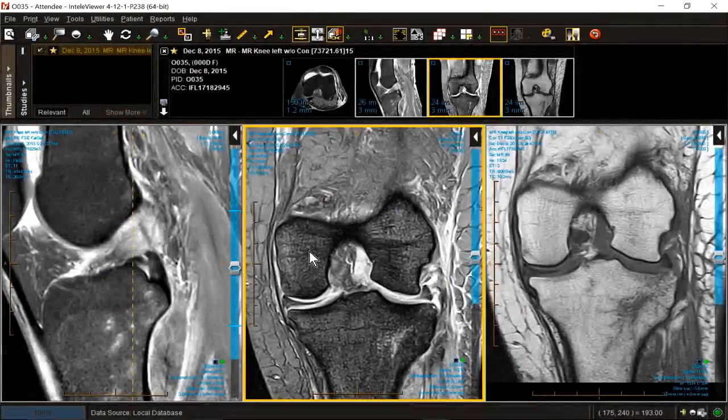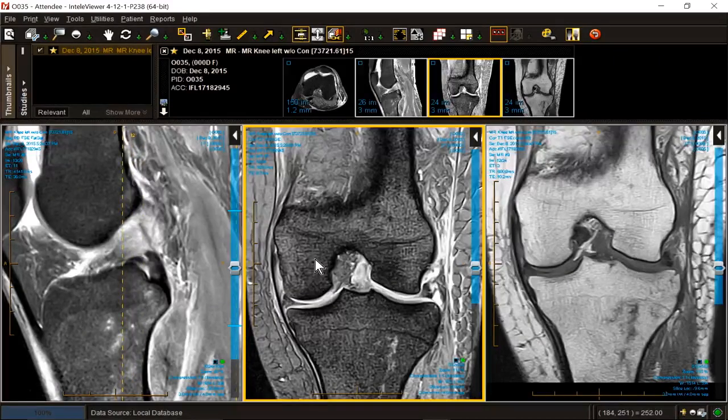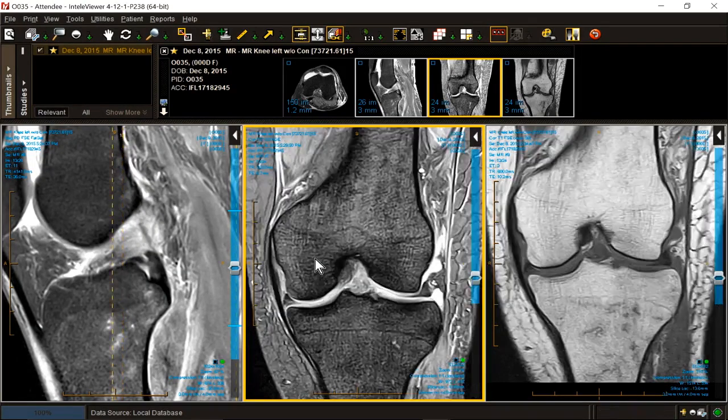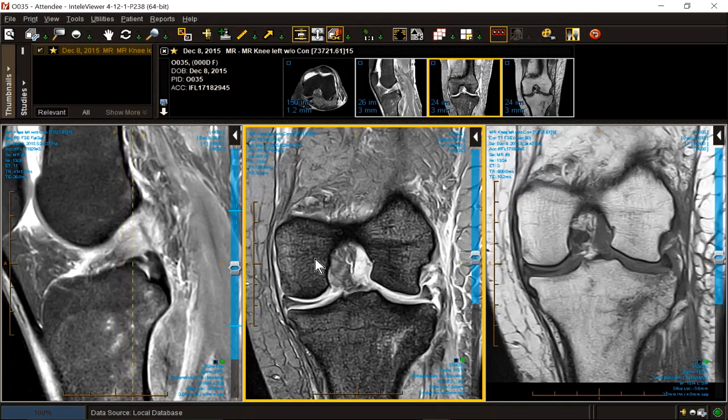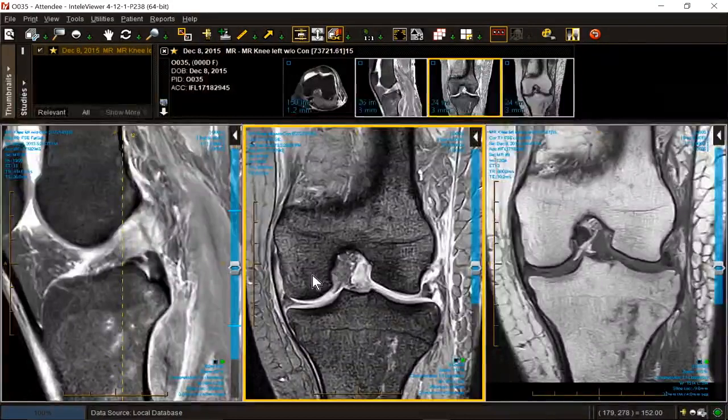It's usually vascularity. If I've got a serious injury like this, and this patient's middle-aged, she's actually 54, got the age wrong. Okay, I'm going to expect, as we described in our initial lead-in to MSK, I'm going to expect to have some signal inside the menisci. So I now decide, is that meniscus signal closed or open?